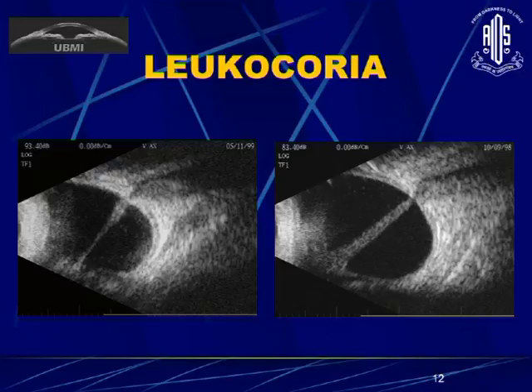But whereas if there's a closed funnel detachment, it is a thin attachment at the posterior pole and it fans out as we go anteriorly. So that helps us to differentiate a PHPV from a closed funnel detachment. Obviously, the treatment is different, prognosis is different.